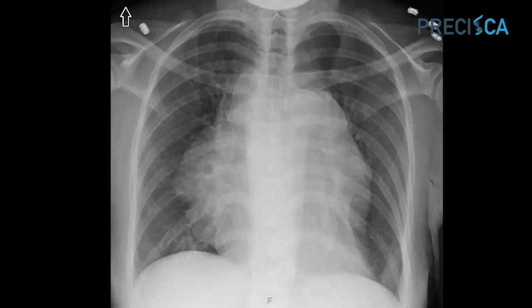So, this first case is a woman who is 24 years old and pregnant who came in with shortness of breath. I think that you don't have to really have much experience in reading chest radiographs to realize that it's grossly abnormal and there is a mass that is sitting somewhere in this person's thorax. The fact that it crosses the midline suggests it's mediastinal, and the fact that you can see the vessel running right through it, the so-called hilar overlay sign, suggests it's anterior mediastinal. So it's a very good look for an anterior mediastinal mass.